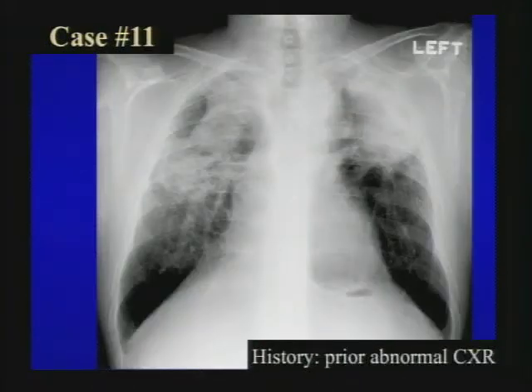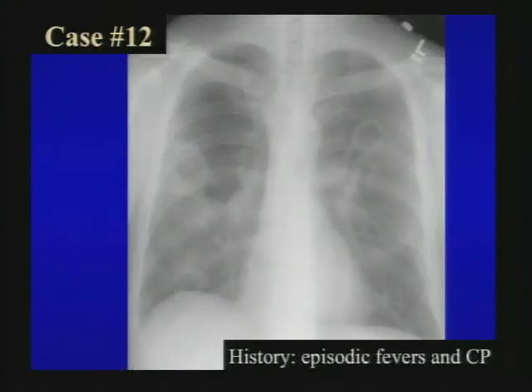Distribution of findings. Another radiology classic. This was originally described with one disease, but in fact that disease is very uncommon these days, and so there's definitely a differential diagnosis here. Probably the differential, number 1 in this, is actually the same as the last case these days. Nice classic radiology differential.